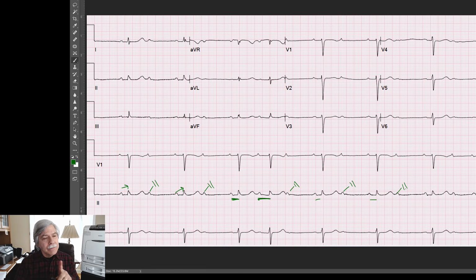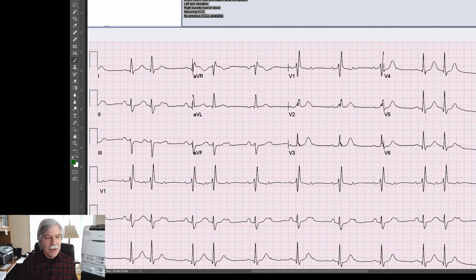Okay, but now here's another example of a cardiogram, and I got both of these in the same week. This actually goes to Tulow's law. Look at what the computer read on this cardiogram, up at the top here. It says sinus rhythm with premature atrial complexes.